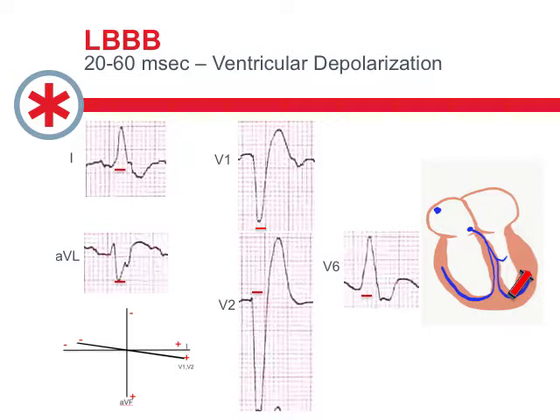And if you think about it, that makes sense because the left ventricle is really a posterior structure of the heart, and the activation is going to come from the right ventricle, which is more anterior, and is going to light up the left ventricle, which is more posterior. And so that current is going to be traveling basically from the patient's anterior chest area towards the posterior aspect of the left ventricle. So what you're really going to see is an arrow that looks a lot like what is diagrammed there in the red arrow on that beautifully drawn heart.